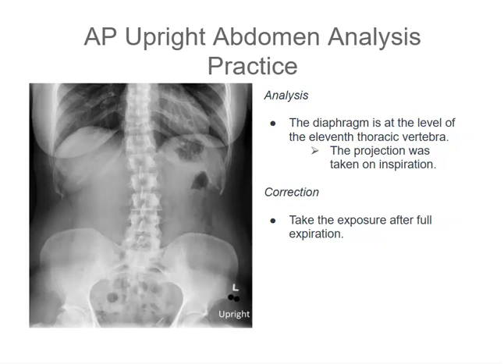Next, you want to look for rotation. We're going to look at the iliac wings to see if they are symmetric, which they are. With this patient, we want to look at their spinous processes and their alignment down the midline of the vertebral column. And for the most part, they are aligned. However, there is a little bit of scoliosis here, so don't let that throw you off, because those spinous processes and the transverse processes there are still equidistant.